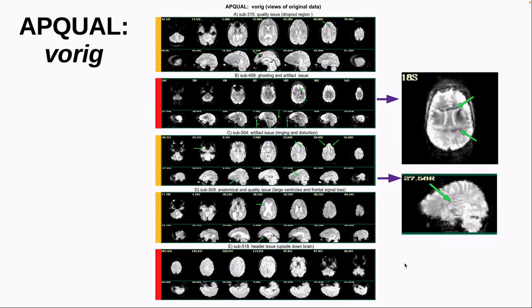Okay, so let's now look at some examples from the Frontiers data of problems. So we saw lots of different kinds of problems. Let's see what they look like in the same kind of index HTML pages that we just looked at.